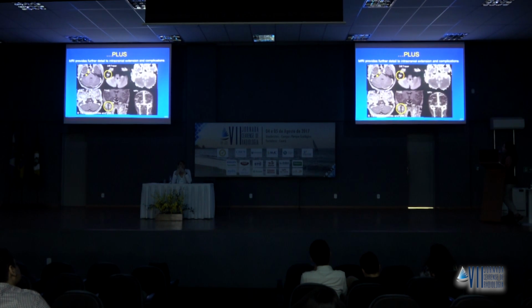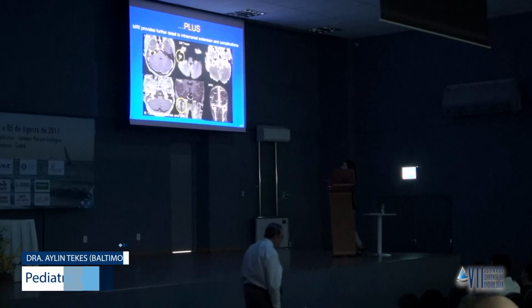On the diffusion trace image, you can see the restricted diffusion bundling up in the mastoid air cell region. So that confirmed the presence of pus and abscess formation in that area. One of the other complications, other than what I have just described, is vascular complications because, as you know, the temporal bone is very close to the skull base and multiple veins and sinuses. Luckily, this patient did not have any dural venous sinus thrombosis at this time.